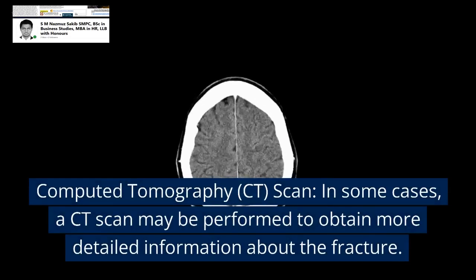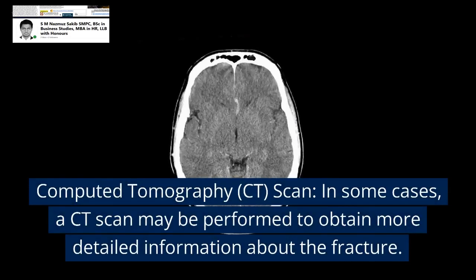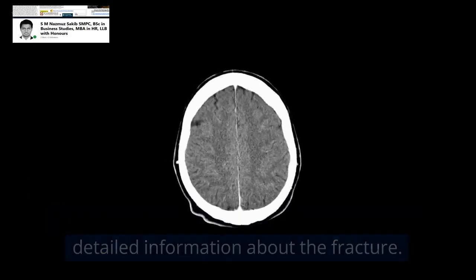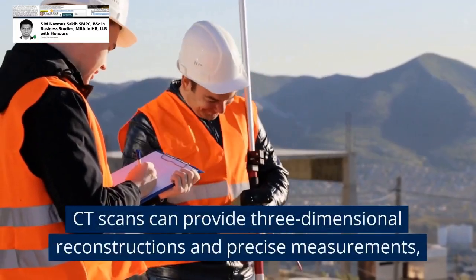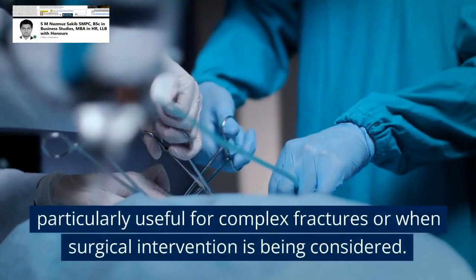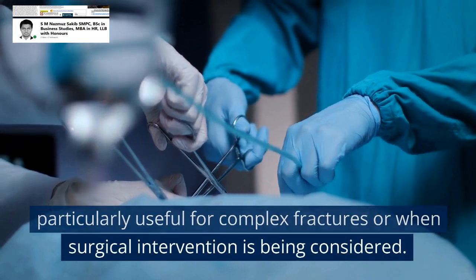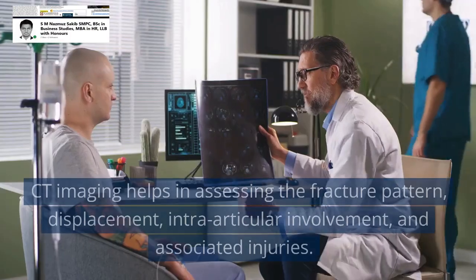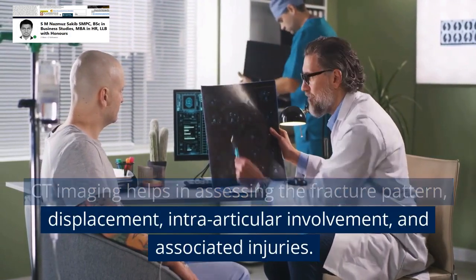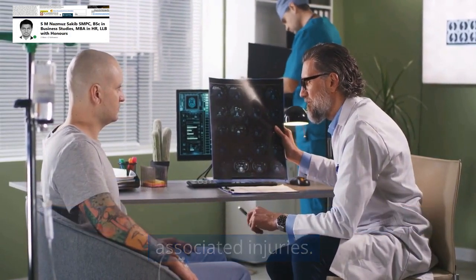3. Computed tomography (CT) scan. In some cases, a CT scan may be performed to obtain more detailed information about the fracture. CT scans can provide three-dimensional reconstructions and precise measurements, particularly useful for complex fractures or when surgical intervention is being considered. CT imaging helps in assessing the fracture pattern, displacement, intra-articular involvement, and associated injuries.